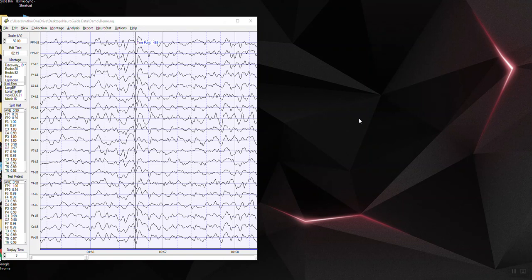Feature inside of NeuroGuide called the time domain capture using the NeuroNavigator. Essentially, this allows one to explore in detail any single event or group of events that one may visually detect in the EEG, such as an epileptic spike or a gross pathology of some type, or whatever event you want to evaluate. It could be an alpha burst or a theta burst, etc.